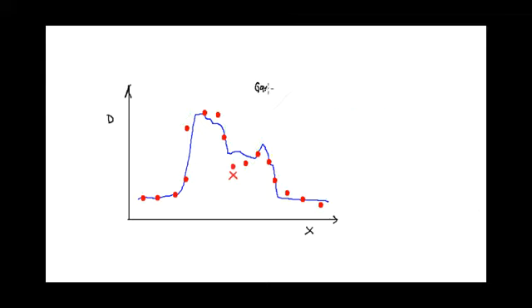So this is called gamma analysis, and the gamma is some combination of distance and dose, as I showed you. And this circle here is defined as gamma equals 1, and we can change the size of that circle.